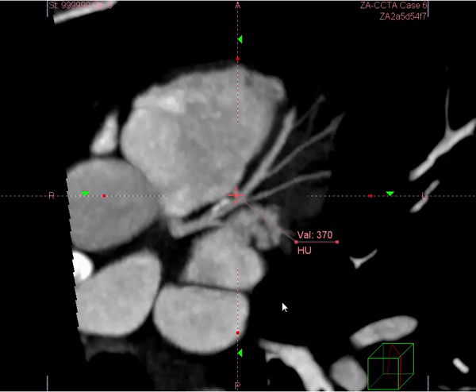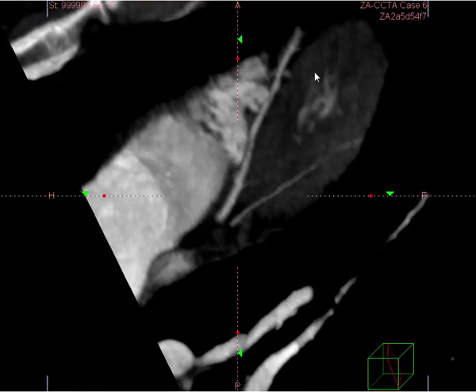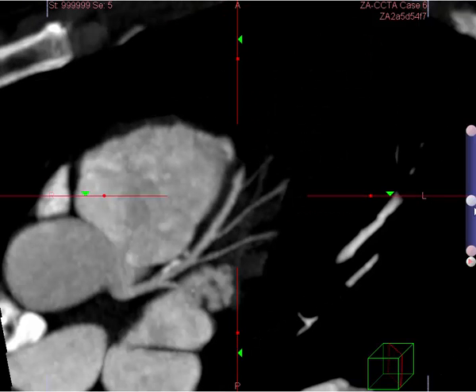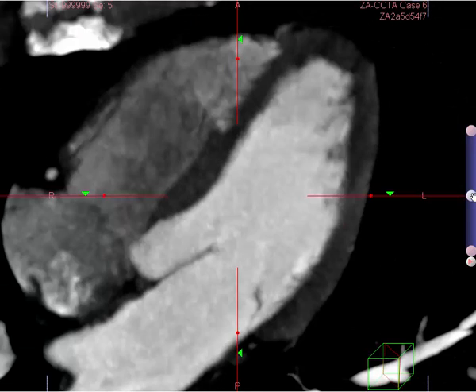So this is very close and would increase the likelihood that this is an ulcerated plaque that has now gotten contrast into the mural surfaces. This is a complex anatomic situation, but it is not obstructive. Remainder of the left anterior descending otherwise is normal. Let's proceed quickly to look at the other coronary vessels.